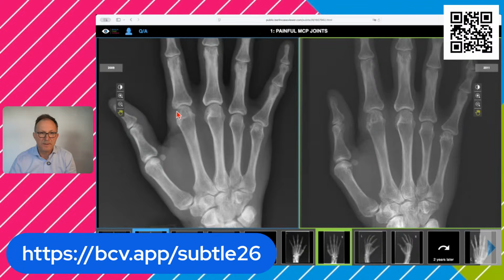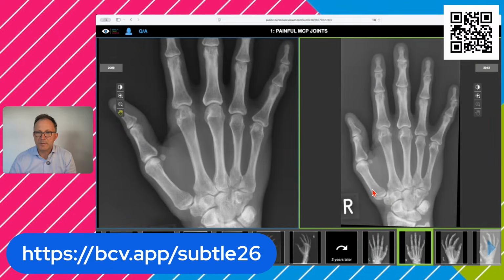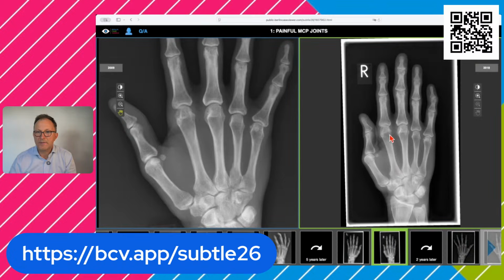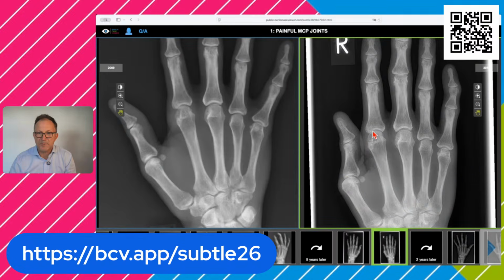You could have some doubt here, but now you see these cystic areas clearly represent severe bony destruction. And then you can follow this up for many years. Here it's more or less similar, but then after almost 9 years, joint space narrowing. And you can also see that the erosion somehow has stopped from progressing to mutilation, so it's well preserved.